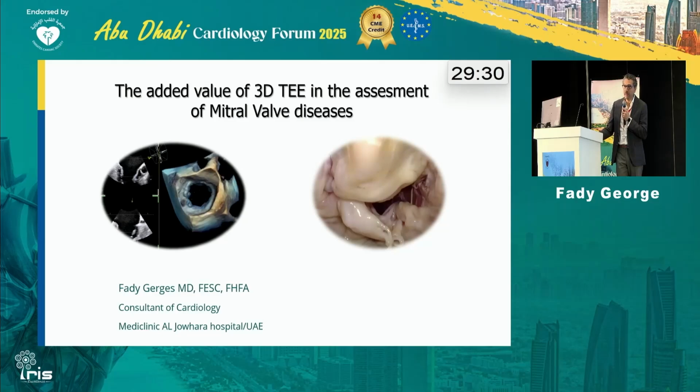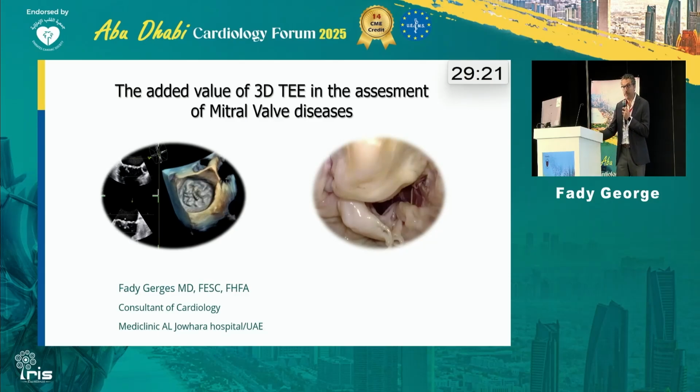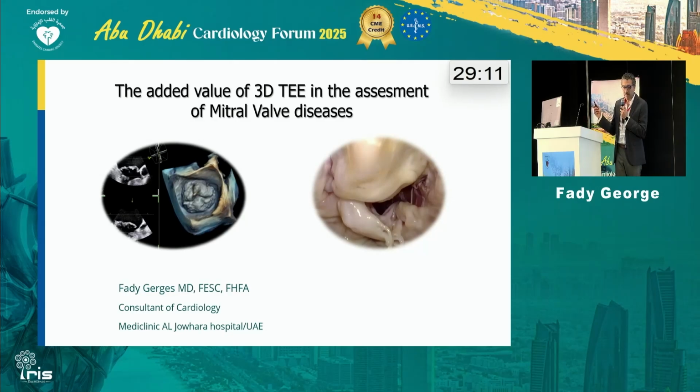We'll go through a lot of spectrum of the mitral valve disease, including prolapse, flail valves, cleft valves, dehiscent valves, even paravalvular leaks, real images. Most of the images basically, I'm not going to talk a lot. There are not a lot of phrases, paragraphs. It's going to be everything demonstrative. So this is just the beginning.